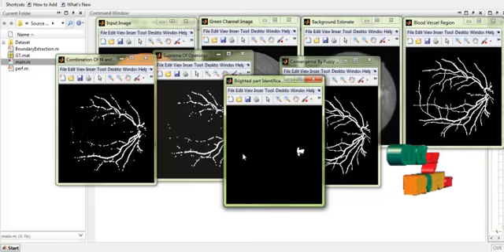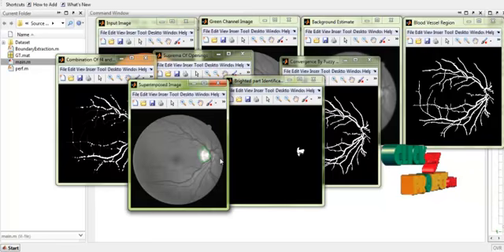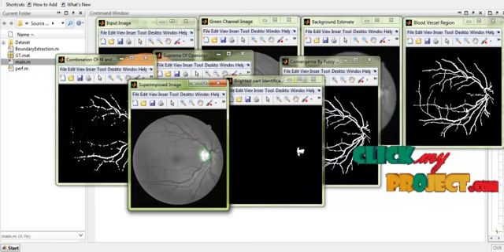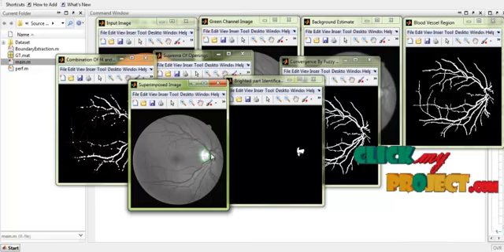So these brighter parts were identified in the input images. This brighter region is superimposed to the original image. This is superimposed to original image, and in that outer contour is drawn in the input images. Hence we have identified the blood vessel regions in the input images, and we have detected the brighter portions in the input images, and the contour is extracted around the images.